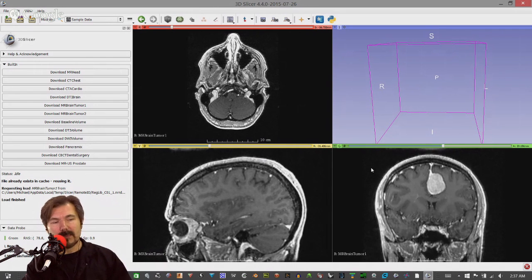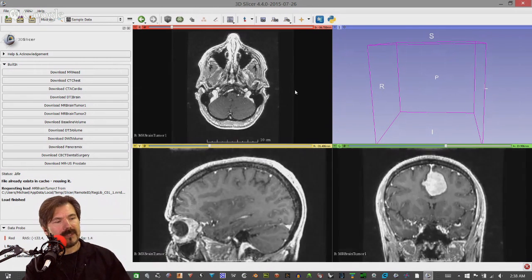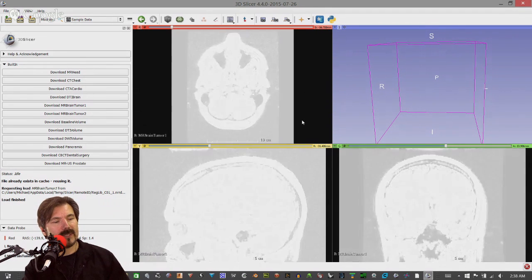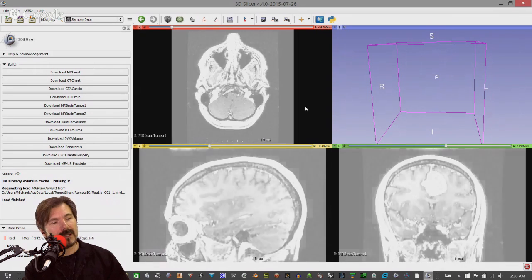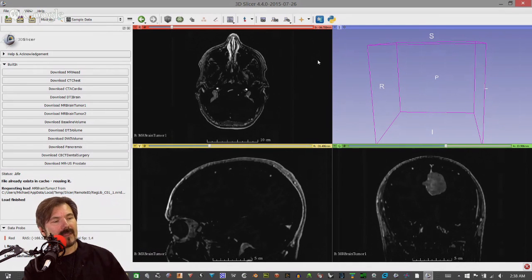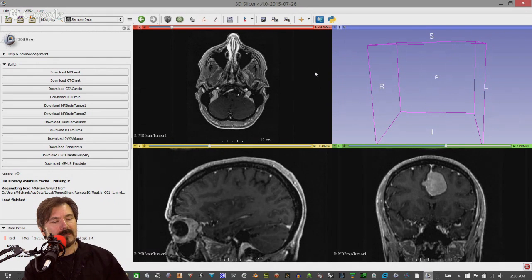The other button that becomes useful is the ability, if you hold the left mouse button down, to adjust not necessarily the threshold, but the grayscale level of the document. If I pull it down, notice that we can blow it completely out. If we bring it the other direction, we can go all the way to black. And then what we want to do is create a compromise in between.